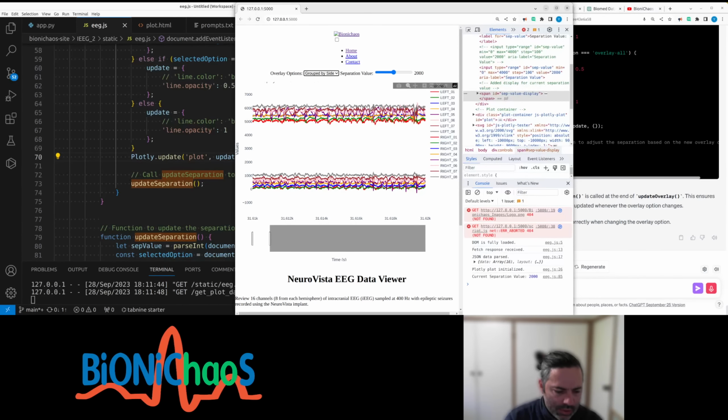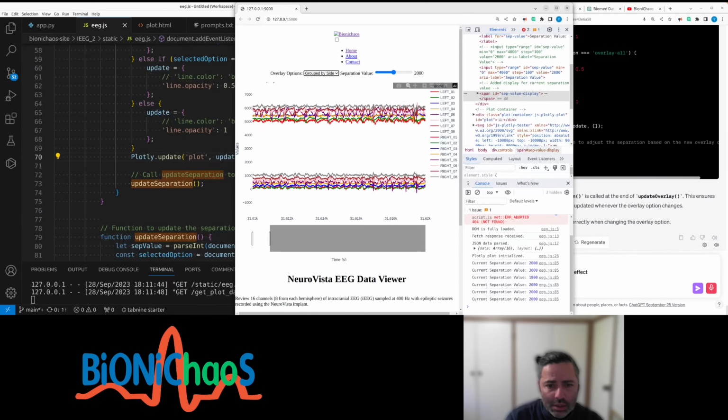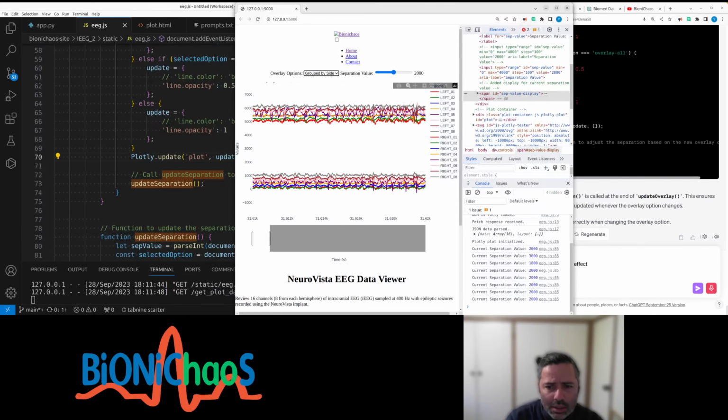Right, now it's working. And this, yeah, it says expecting won't take an effect. Right. That's exactly what we wanted. The colors should remain the same. That's great.